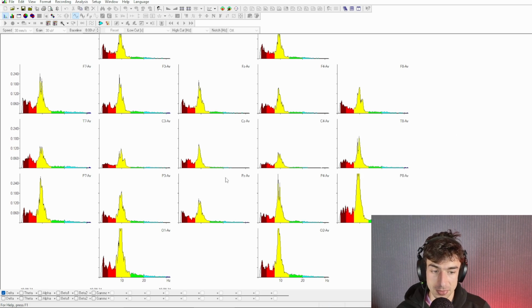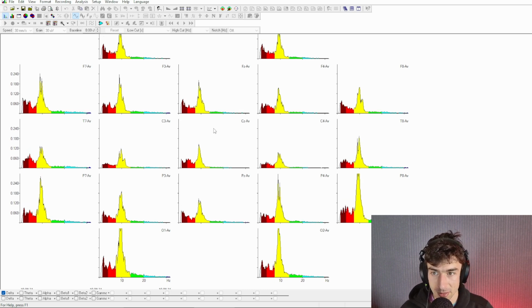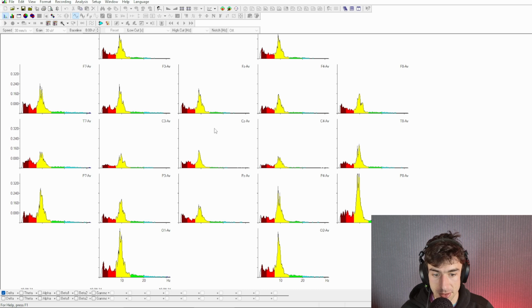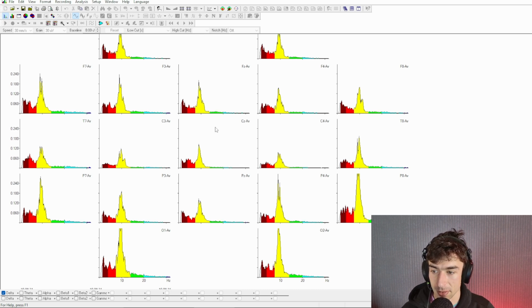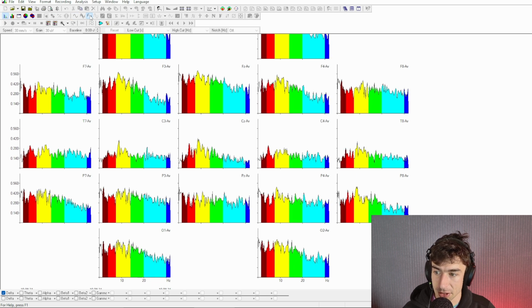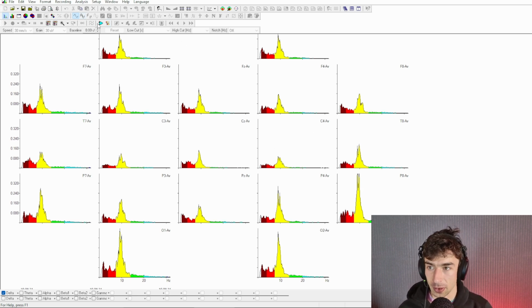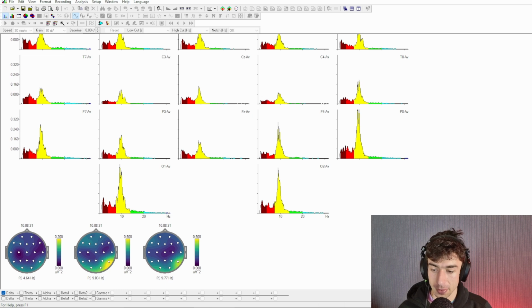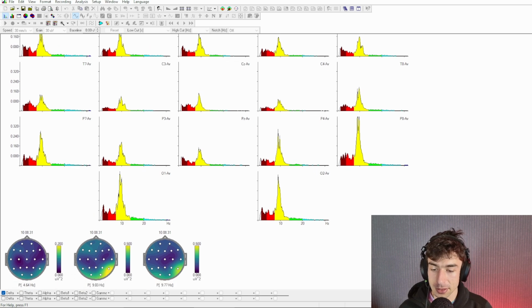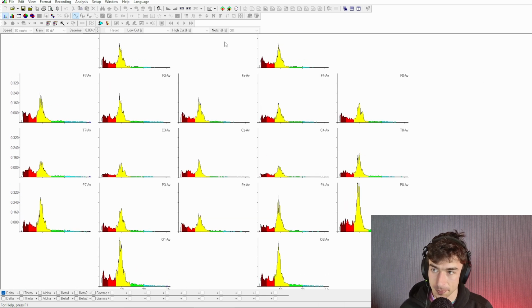And is there anything else that we really want to grab? There's not a whole lot of significant peaks in the beta range. It's sort of just disorganized beta. So we can take a quick look at the average EEG coherence, and nothing really jumps out. It's not really a valid assessment with this little data. So yeah, there's a right posterior dominance to the alpha activity.